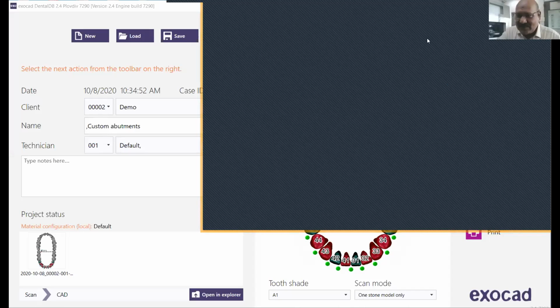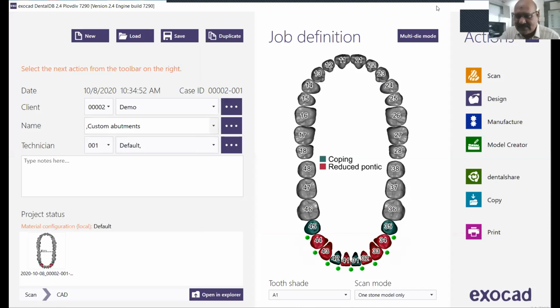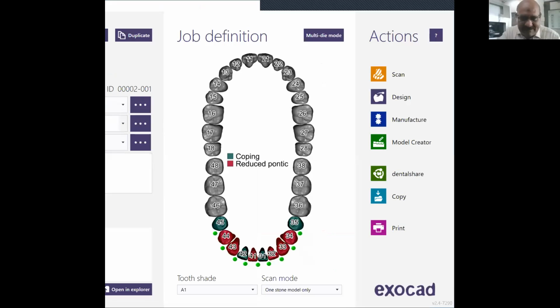Ma'am, allow me to, I think this data is not transferred properly. Where is that?